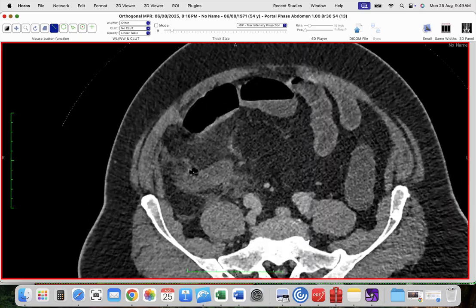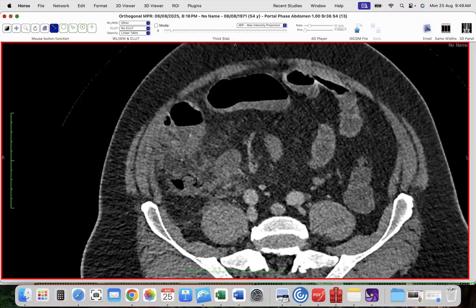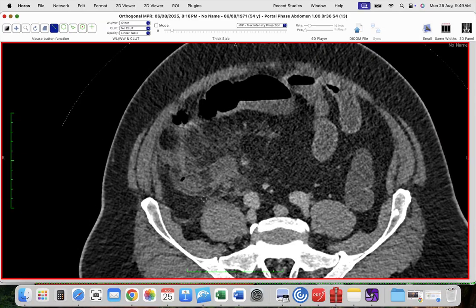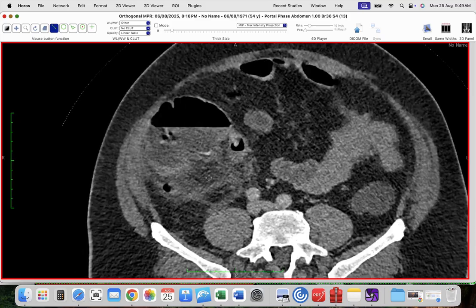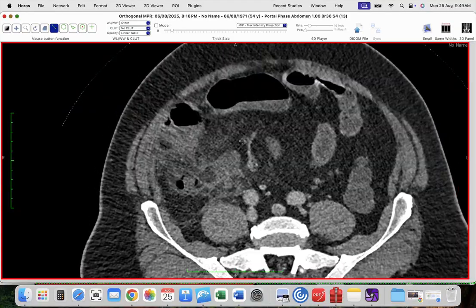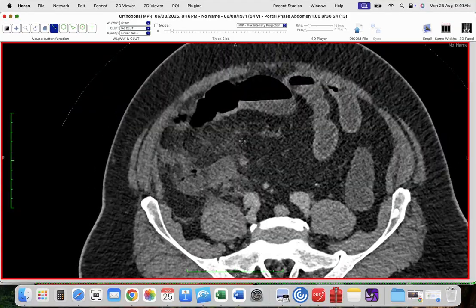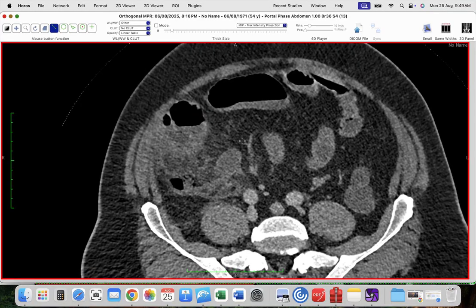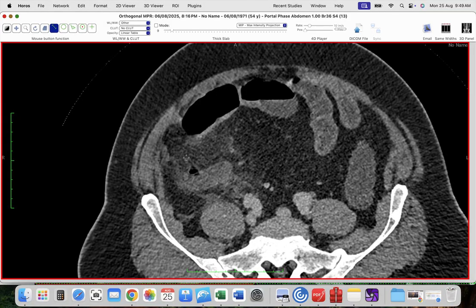with multiple air foci extraluminal around the appendix, and the appendix is surrounded by moderate fat stranding, and the base contains a small fecalith. Somehow you can say this is a classical appendicitis secondary to the fecalith noted at the base, and there is a concealed perforation with inflammatory mass formation around the appendix, and you should mention this in your report.